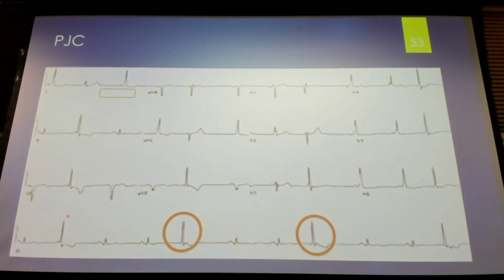All right, so we have here very low amplitude in our QRS. Then we have these tall waves that occur right here, and tall waves that occur here. They're occurring a little bit earlier than we would expect if we measured it out; it should occur about right here. They have no P in front of them, they're highly inverted, and we go back down to our normal PQRS, PQRS. These are two premature junctional contractions occurring earlier in the cycle than what we would think.